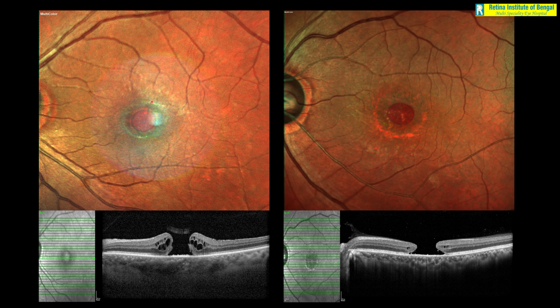So on the macular hole on the left, you can see there is a greenish hue all along the rim, neuroretinal rim, all along the rim of the macular hole. Now we have already discussed that if the retina appears green, it means it is elevated, it is edematous, or it is getting lifted. So here you can see these cystic changes on the edges of the macular hole in this eye. And we know presence of such intraretinal cystic changes suggests that this hole, even though it's large in size, is not very chronic, and therefore not only likely to close with a single surgery, but also there is a hope of some visual recovery.